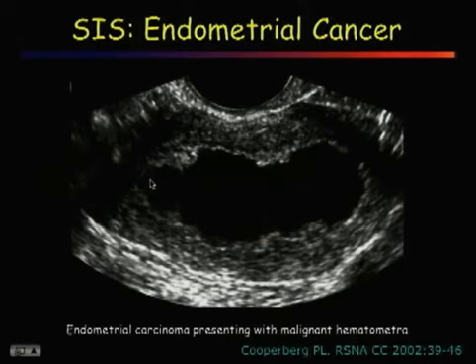Here's another cancer from PC. Here we had a cervical stenosis or occlusion with a malignant hematometra. You can see that there.